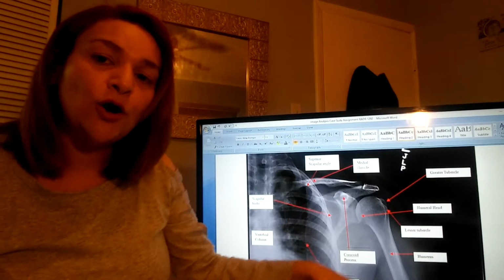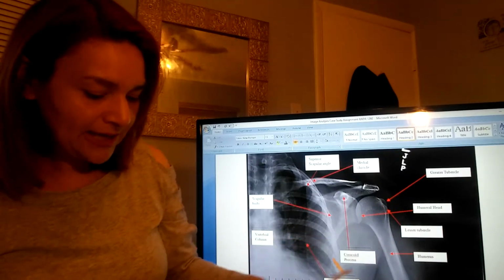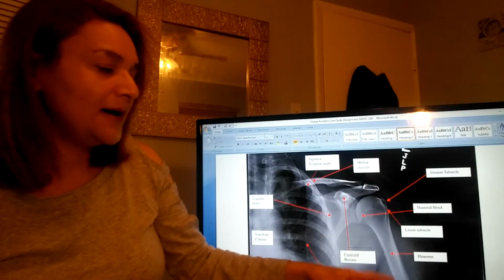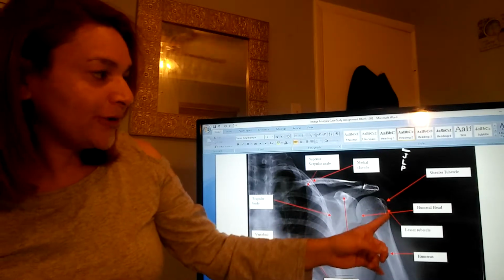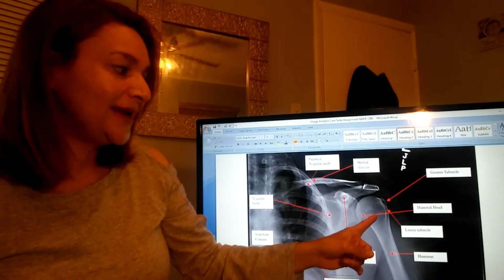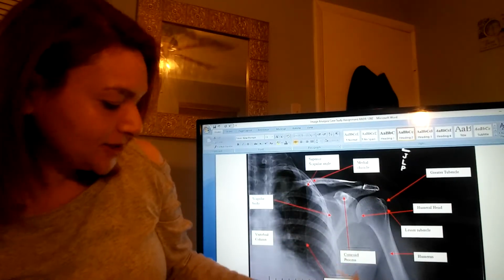She was actually over externally rotated, which brought this a lot closer. Whenever you have your epicondyles parallel with the IR, your greater tubercle is going to be in profile, and your lesser is going to be anterior to it at a 90 degree angle, and obviously it is not.